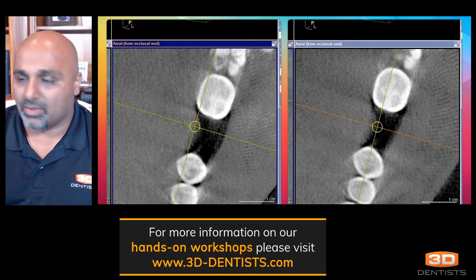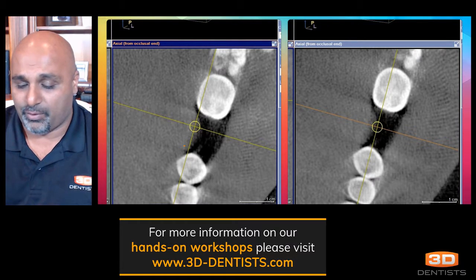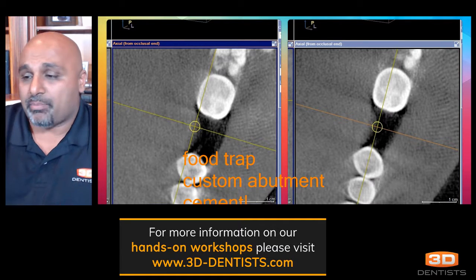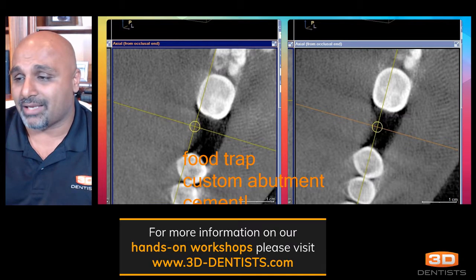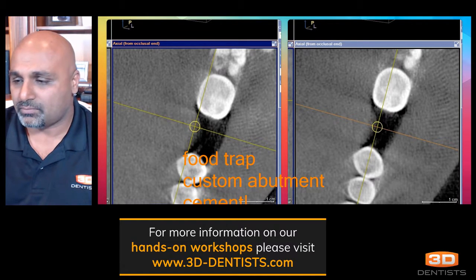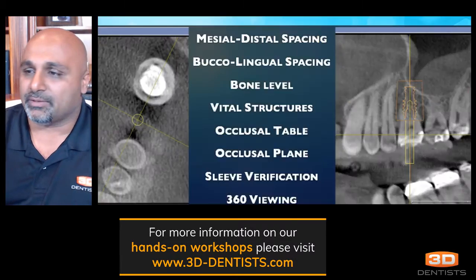So, and then the key on this one is to look at the screw retained. So this one, the one here on the left, will leave a food trap and the need for a custom abutment and the need for cement. So the food trap hurts the patient. The custom abutment hurts the patient in terms of cost and us as the dentist in terms of cost. And the cement, we know that literature is showing that roughly 80% of the time we're leaving cement behind. So we want to make sure that we're getting rid of everything there.